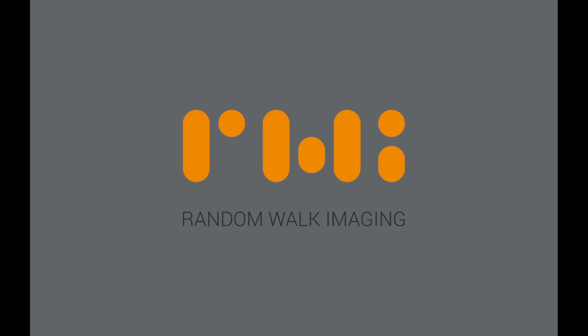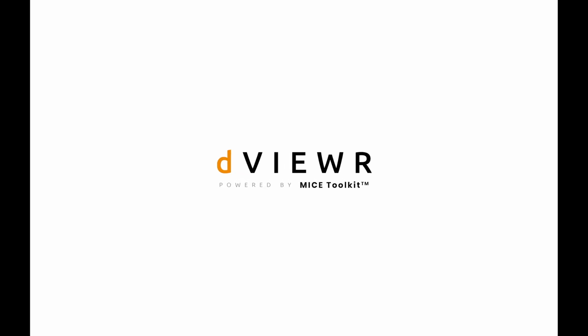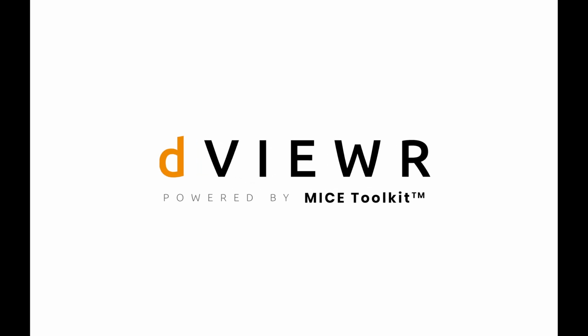Hi, can you imagine a world where radiologists are empowered with the most advanced non-invasive image visualization tool? A tool providing them with actionable diagnostic information. We call it dVIEWR, a unique software solution using diffusion MRI to non-invasively look at microstructural tissue changes at an unprecedented level of specificity.